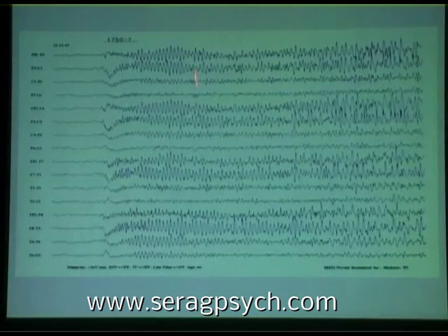And then I want to show you this again so that you get used to seeing it, these regularly repetitive rhythmic waves which could be misinterpreted as artifact or muscle activity, or maybe medication effect. Always compare it with the background activity, which contains nothing like this. This is the epileptic recruiting rhythm, and it is associated in virtually 100% of patients with a seizure disorder, either seizures of the absence type, they can have an absence attack looking exactly like this, or the tonic seizures.